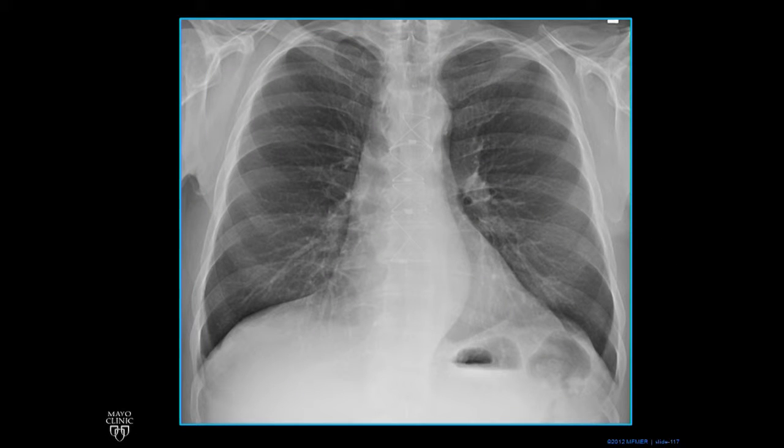New patient. Look at the region of the aortic arch. Does anything seem unusual? There's extra soft tissue right there on the patient's right side. The trachea is narrowed and displaced to the left. So it's a little bit like our last case with the right aortic arch, but there's still a bump on the patient's left as well.